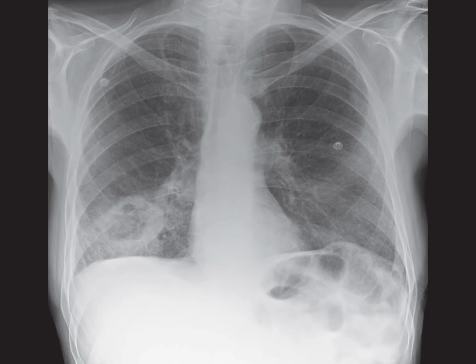In this image, we're looking at a frontal chest radiograph of a skeletally mature patient. The most striking feature here is a large, well-defined, rounded opacity in the right lower zone. This lesion has a thick wall and is located over the right inferior hilum, showing central cavitation.